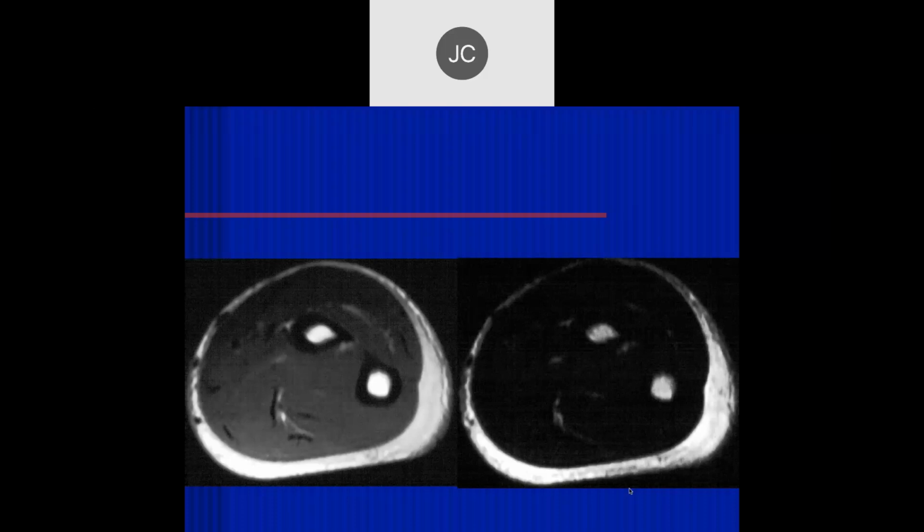All right, so a number of different appearances of olecranon bursitis here. This is a T1 and an old-fashioned T2. Not very revealing. On these old-fashioned T2s, fat's not usually this bright. So this is actually some fluid and hemorrhage that's extravasated from olecranon bursitis. So let's skip that.